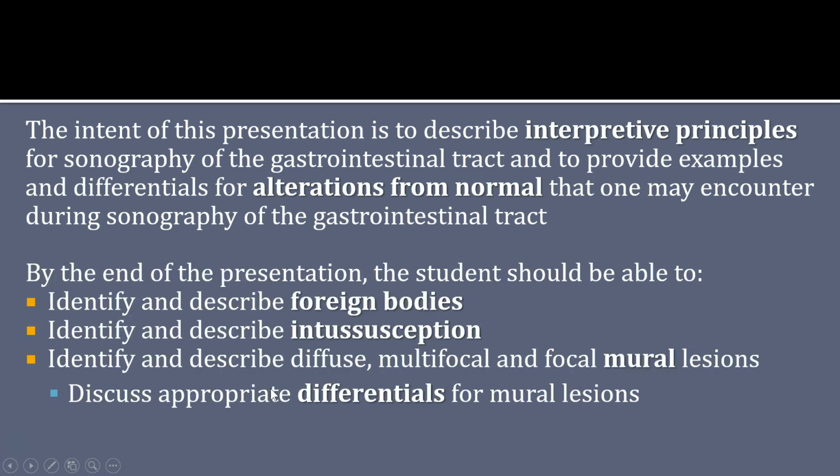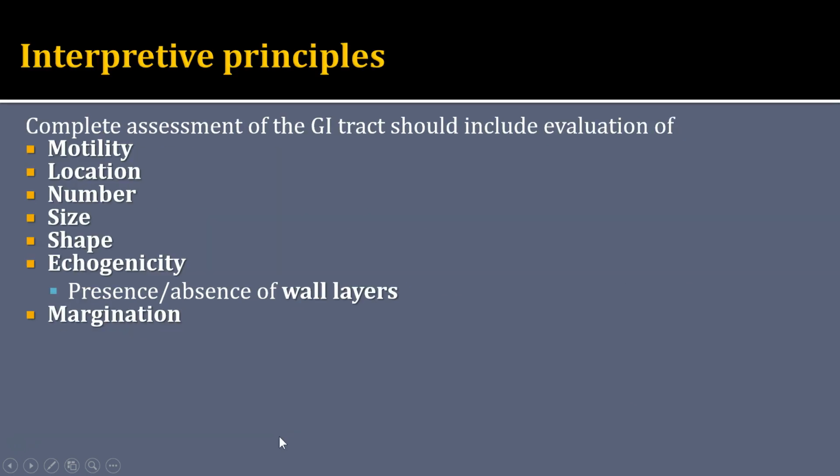By the end of the presentation, you should be able to identify and describe foreign bodies, identify and describe intussusceptions, and identify and describe mural lesions, which may be diffuse, multifocal, and/or focal. In addition, I want you to be able to have some appropriate differentials for those mural lesions.